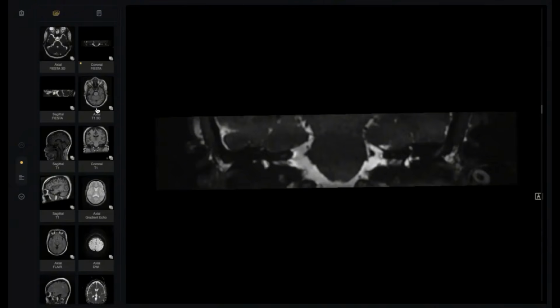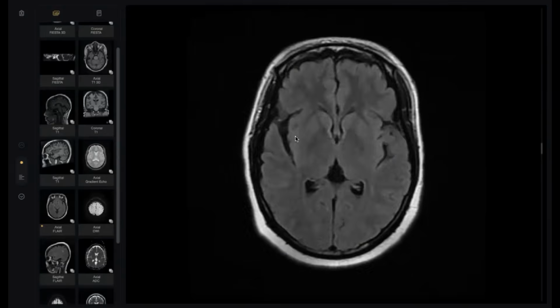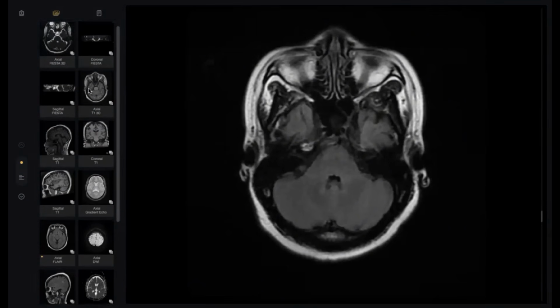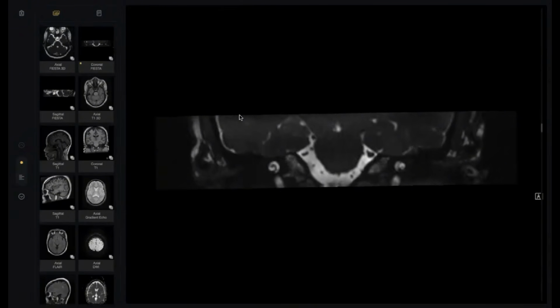But why? Because if I give you FLAIR like this, what will you do? Nothing. Why? Because this is low resolution. So we must ask for another high resolution sequence. Go on, doctor. So in this, yeah, it is scrolling. Yeah, good.